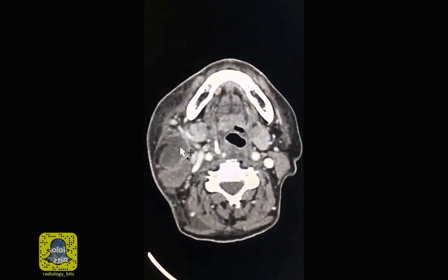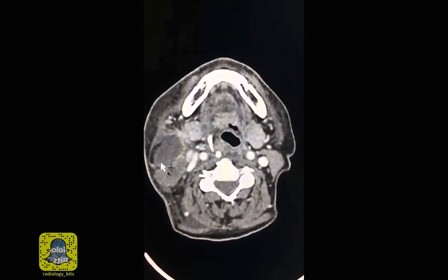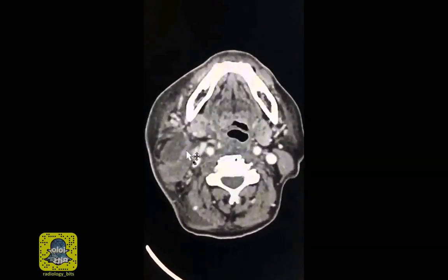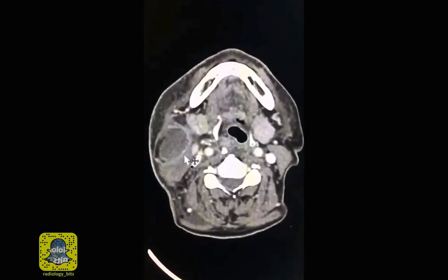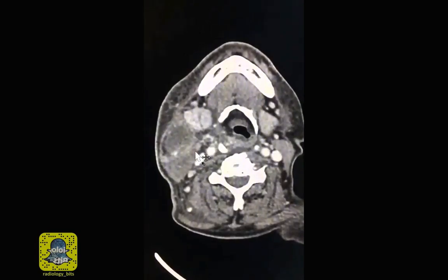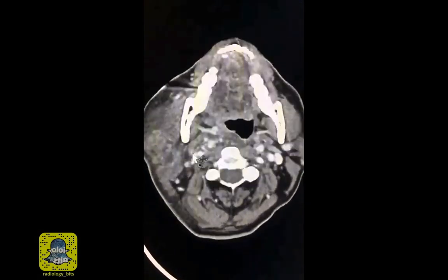A primary tumor such as sarcoma or schwannoma could be necrotic, but in that case, you'd expect to see some more soft tissue components as well. You may also think about a vascular abnormality such as a thrombosed aneurysm, but in that case, you'd have some more enhancement and connection to a vessel. Another vascular category would be of lymphangioma or venolymphatic malformation, and these could be superimposed by infection.